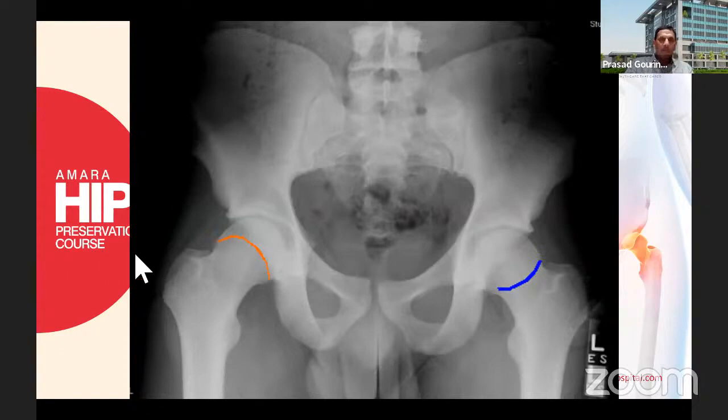Here's a prominent epiphyseal extension sign going way onto the neck, and you can see the big bump on top of it. Even if you don't see the bump, if you see this sign, that's a sign of cam that's present in a different plane. Here's your sagging rope sign, a density on the side, which is the outline of the head. So this head is deformed, oval shaped, a cam here, and a sagging rope sign saying that the anterior wall is extending onto the neck. That's a sign of an aspherical femoral head.